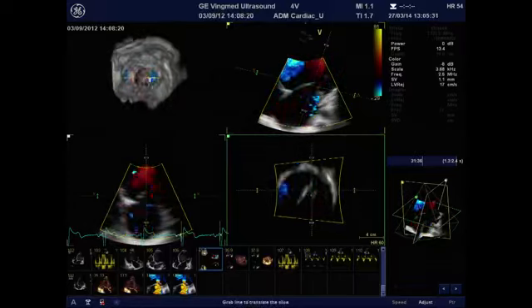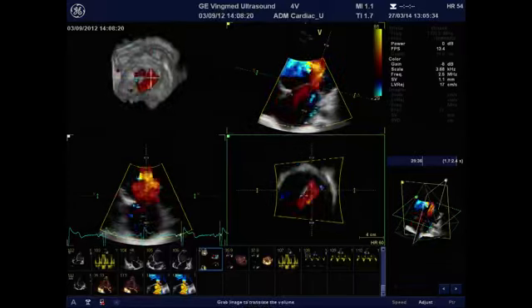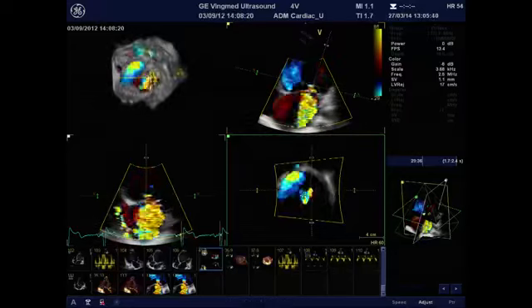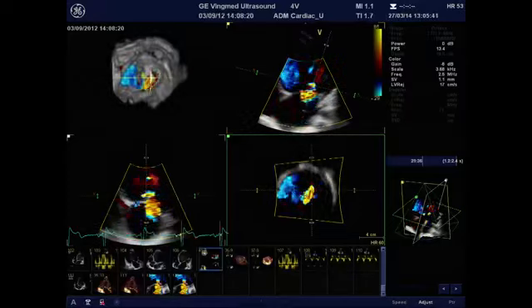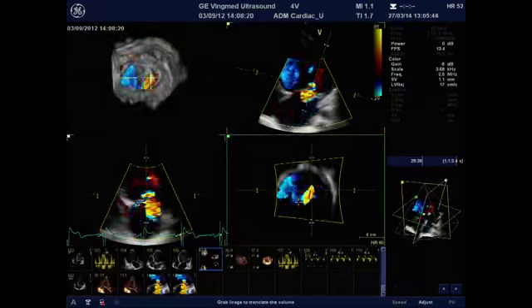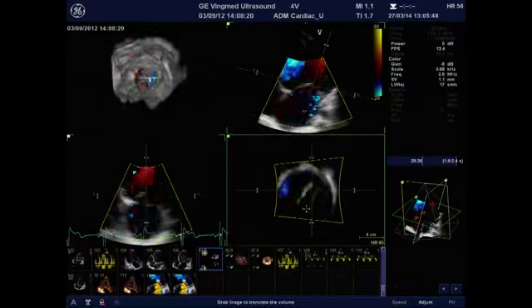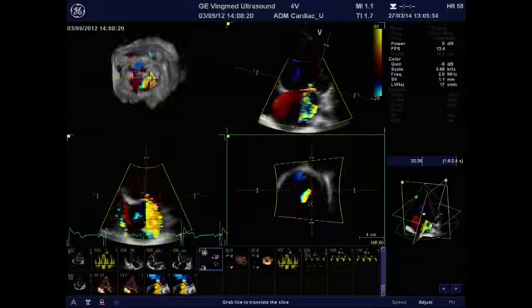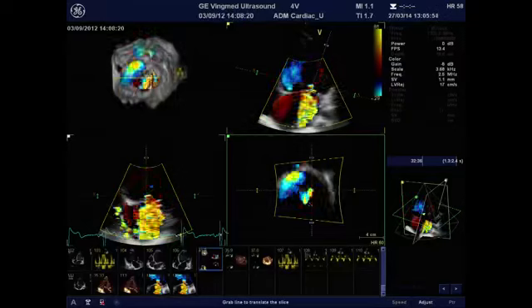And if we are exactly located at the level of the regurgitant orifice, there is something very strange here. This is the regurgitant flow at the level of the regurgitant orifice, and you have the shape. So this means that it's the real vena contracta, and if you measure it, you will have the vena contracta area. If you look at the geometry and the shape, it appears completely elongated, not round at all, as you assume that the regurgitant orifice is purely circular.